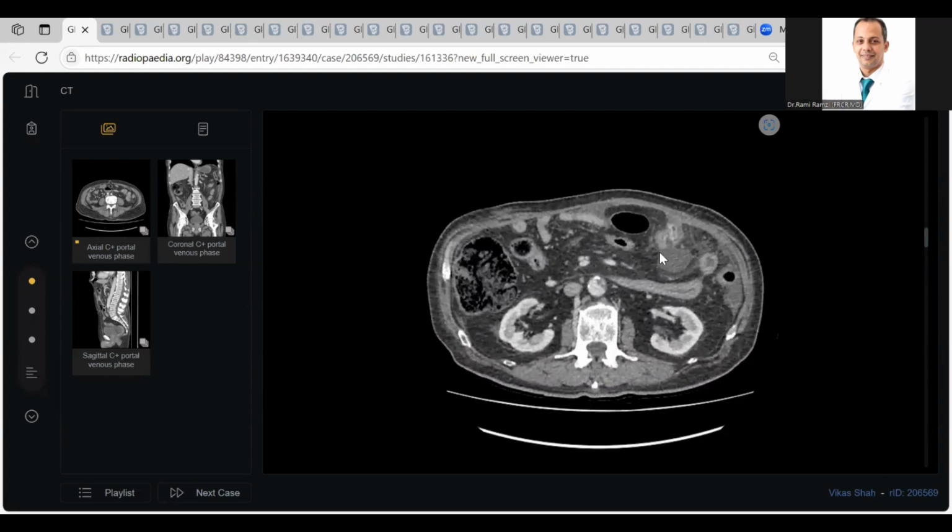There is an area of what I believe is possibly a perforation or dehiscence of the anastomosis that has caused the free fluid adjacent. I think it's seen in this location in the left anterior small bowel loop, and there is a collection around that area.